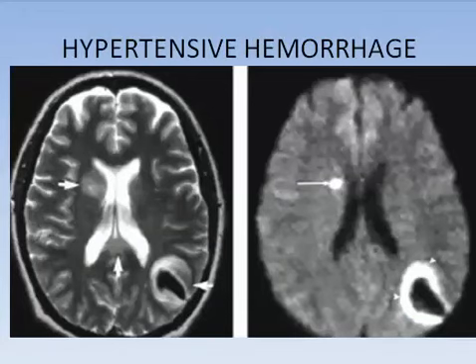Now this is a patient with a small infarct at the region of the caudate, and here it is seen as restricted in diffusion, and here is a hemorrhagic infarct seen as restriction with the dark T2, and as dark T2 it is an acute hemorrhage. Dark T2 is an acute hemorrhage.